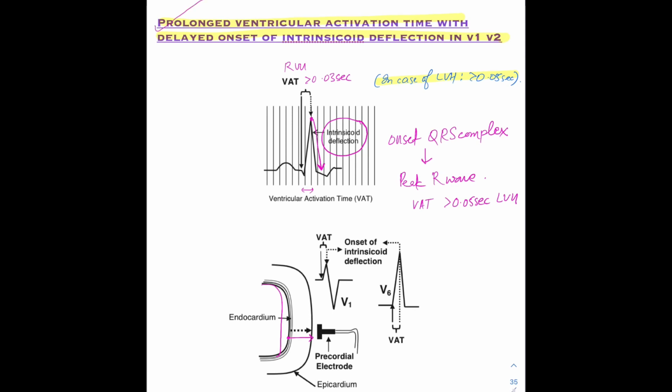Therefore, there is going to be prolongation of the ventricular activation time with delayed onset of intrinsicoid deflection in the leads V1, V2.